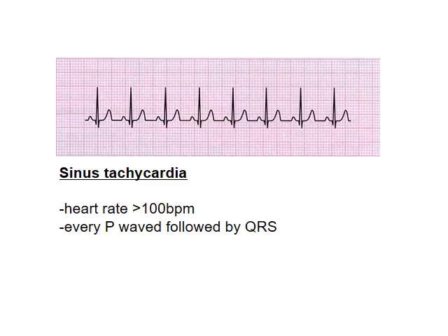Let's repeat the measurement exercise with the sinus tachycardia. What I'd like you to do is measure the rate of this rhythm. Again, pause the presentation and continue when you are ready.